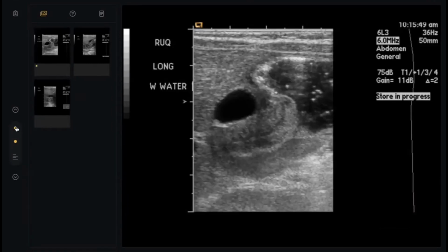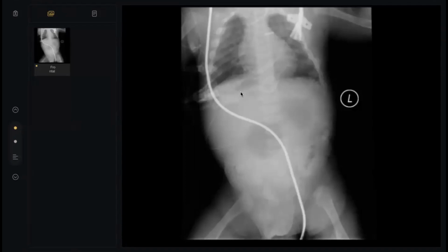See, my colleagues, one advice for all of you. See, there is paucity of gas here. This is the finding, nothing else. So, if you tell the examiner, I suspect there is obstruction, either because it is very proximal, and you see, we can see a gastric air bubble and a nearby bubble here.